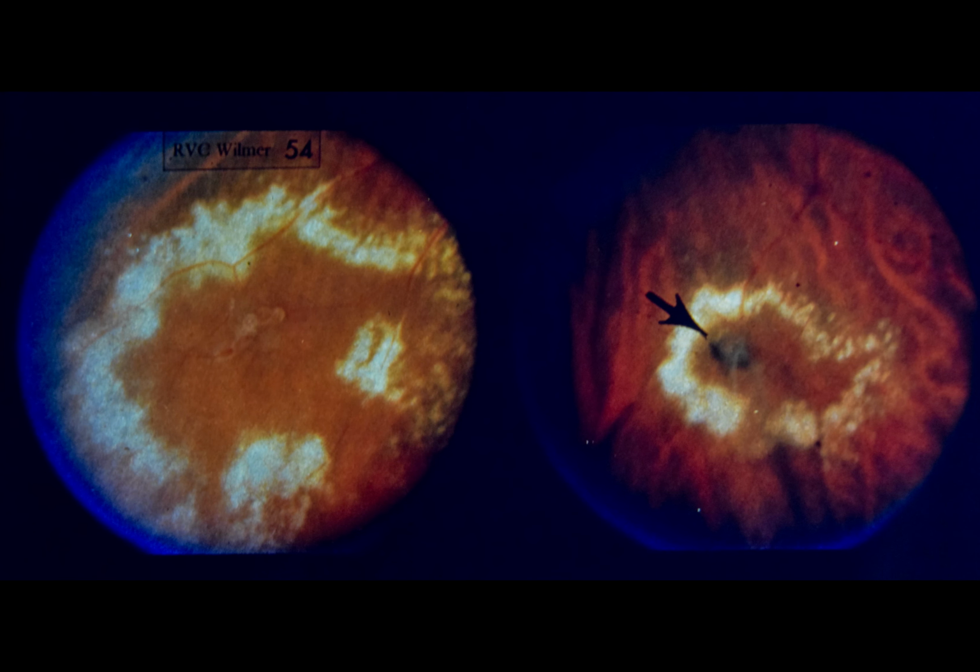Slide 54. Telangiectasis with peripheral circinate retinopathy. This 42-year-old white male sought ophthalmic consultation because of symptoms in the left eye due to posterior vitreous detachment. Visual acuity was 20/16 in each eye, and there was no history of systemic disease. Media were clear in both eyes, and the right fundus was normal.